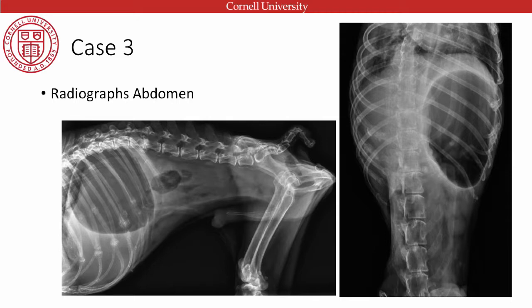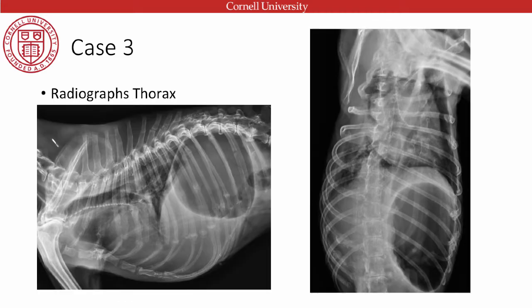Looking at the image here, we have some fractures of her transverse processes of her lumbar spine. It's a little bit tricky to see because it's a little oblique, but when you window this, you can see that there's some fractures through there. They're not complete, unfortunately. And then again, some fractured ribs. When we looked at her thorax, we went through, again, this diffusely fairly lucent skeletal system. She has a sort of malformation of her sternebrae, which I probably wouldn't have looked into too hard. We can see those quite as a consequence of lots of things. Sternebrae can be quite variable.